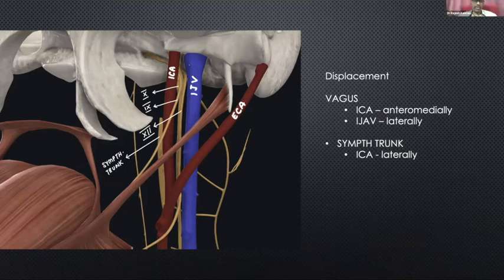If it is a hypoglossal schwannoma, it comes from the hypoglossal canal. Usually it extends into the hypoglossal canal, and there will be widening of the hypoglossal canal, whereas the vagus nerve, the 10th nerve, comes through the jugular foramen. But in this case, there is no widening of the hypoglossal canal. The only thing is there is atrophy of the tongue muscle.